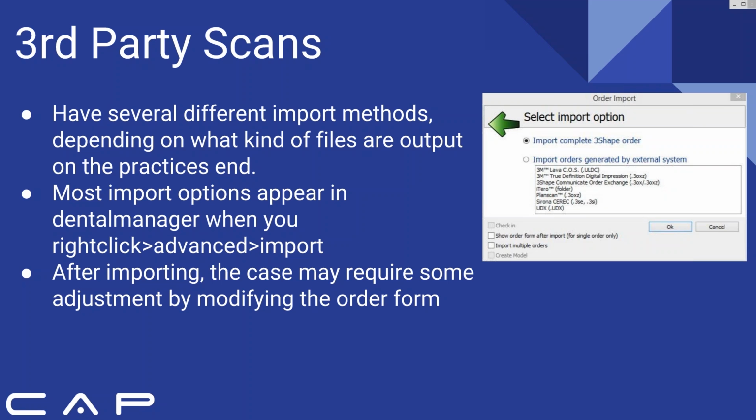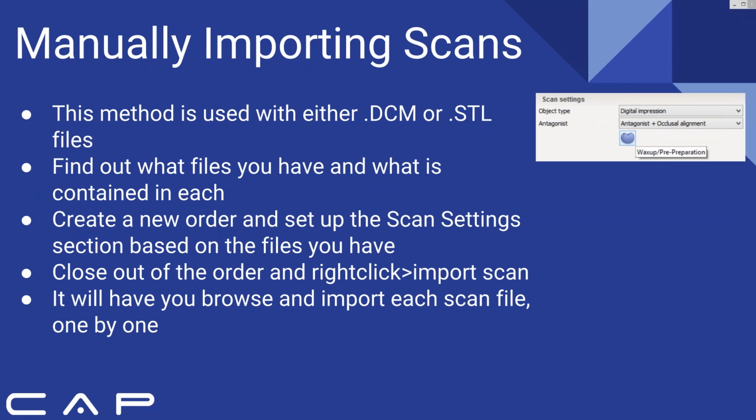And then because you're importing from a third party, most of the time the order form will have a couple of tweaks and changes that'll need to be made, because it's never able to completely transfer over order forms from different systems.